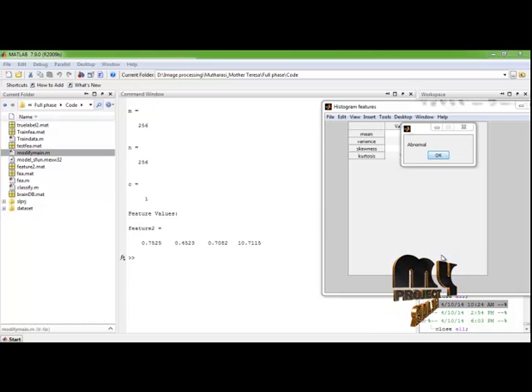For applying the classification method, we determine whether the given input images are normal or abnormal. Finally, from that we conclude that the ischemic stroke region is found in the input brain image, and also whether the image is normal or abnormal. Thank you.